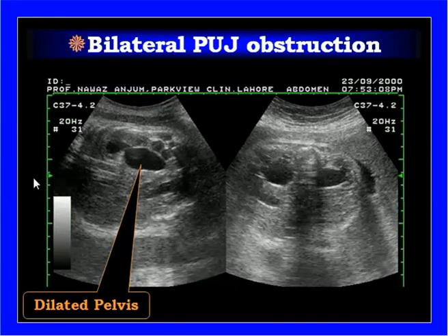Again, intrauterine study of the fetus with dilated renal pelvic calyceal system, moderately dilated renal pelvises, and these are due to the bilateral pelviureteric junction obstruction leading to the dilated renal pelvises of the fetus.